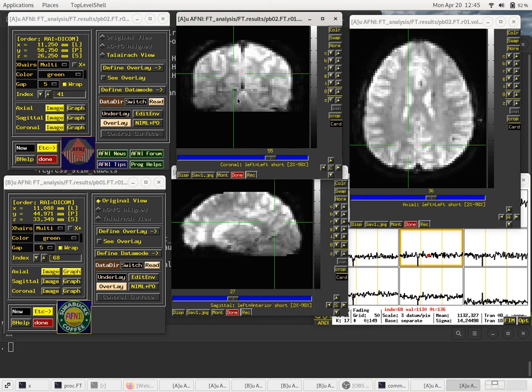It looks like the registration worked well. We can see the volreg registration was applied. We can see the anat and EPI are aligned. We didn't look at the anat aligned with the template. That can be done more as another subsequent step. We'll look at that with the QC perhaps. We don't have a copy of the template in this current directory. So let's stop here and then we'll move on after the volreg block.